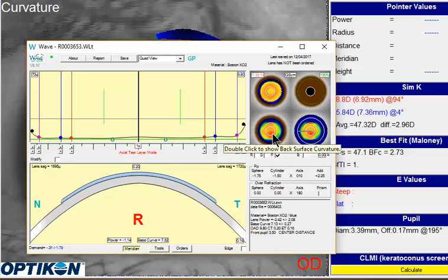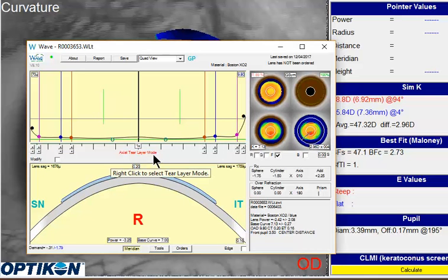So to help resolve that, if we look at your design, overall your design actually looks very nice. It's an axial mode. If you recall, the axial mode tends to represent the central part of the topography very nicely. However, sometimes it doesn't show the peripheral relationship as appropriately. One of the easy ways to address that is if you switch over to tangential design by right-clicking that axial icon in the middle, hit tangential.